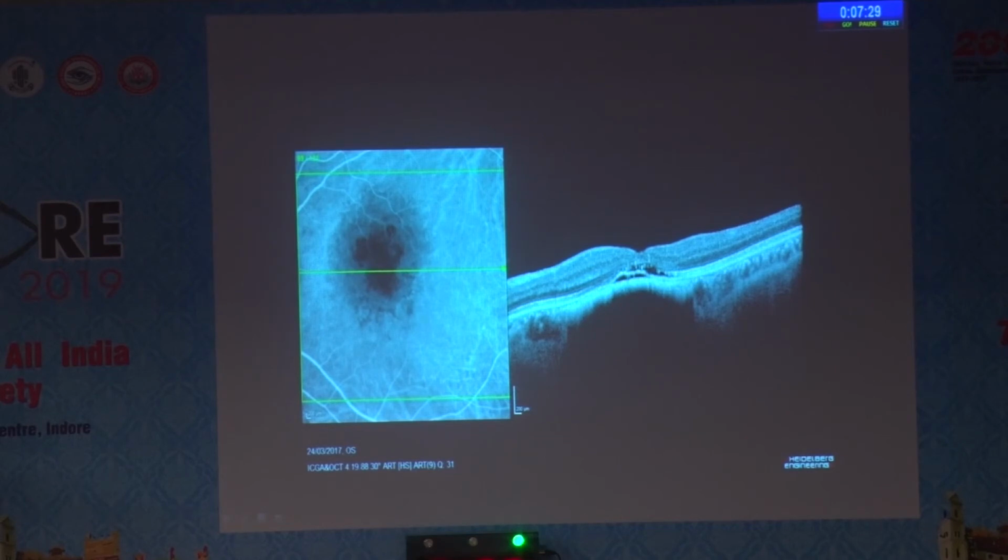It's hypocyanescent in the center. So there is hardly any choriocapillaris out there at all. So this is actually pushing beyond where the RPE would come. It's completely pushed everything out. So that's why the ICG dye is not reaching there. One clue you can see here is that there is no lumen here. There is only a very compressed stromal choroidal tissue. So there is just stroma there now. There's no vascular lumina. Yeah, that's exactly what I was going to say.